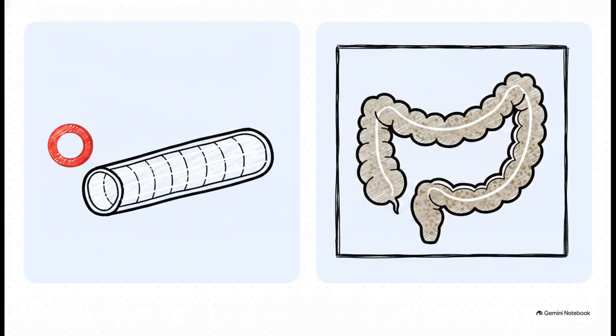Look closely at whether the mucosal lines cross the entire width or just partially, and check if the location is central or peripheral. The small bowel is central and features valvulae conniventes. These are mucosal folds that form complete, thin lines extending all the way across the bowel width. The large bowel, on the other hand, sits peripherally in a frame-like distribution. It features haustra, which are sacculations with lines that only extend partially across the lumen. Plus, the large bowel often contains solid fecal material, which gives it this characteristic mottled appearance.